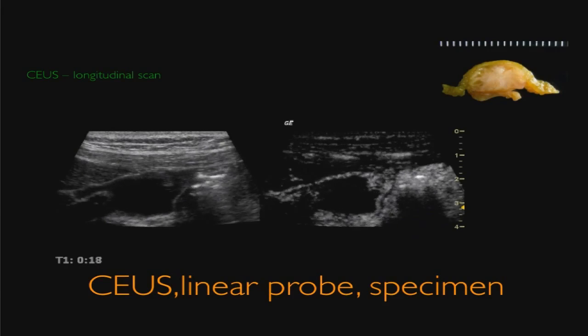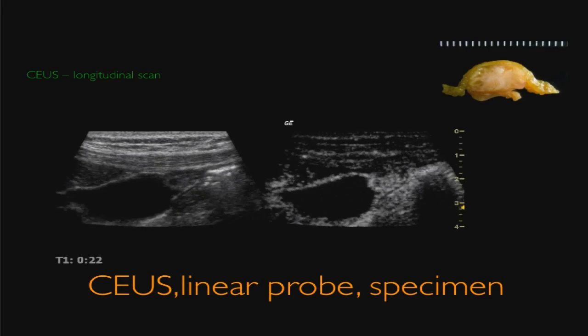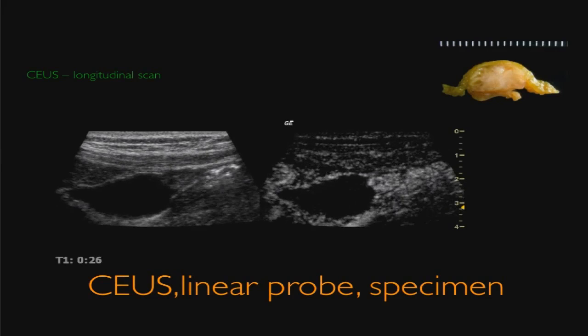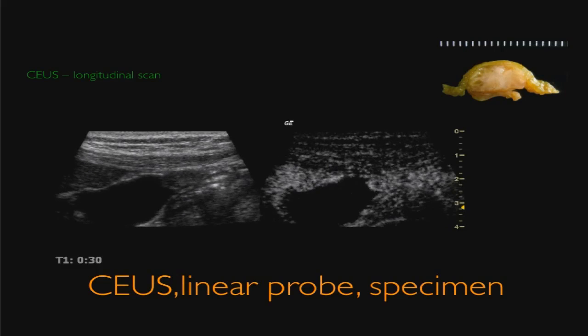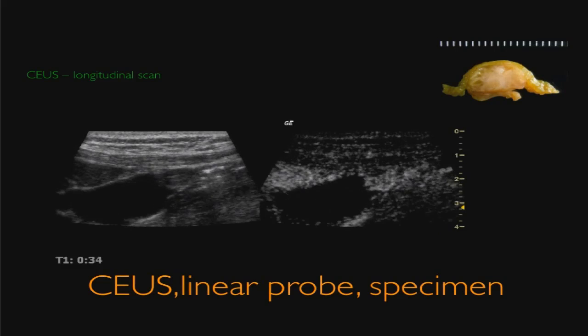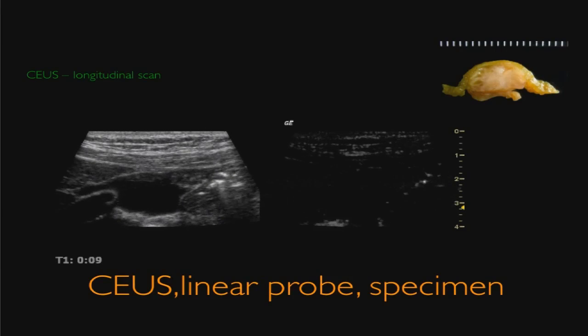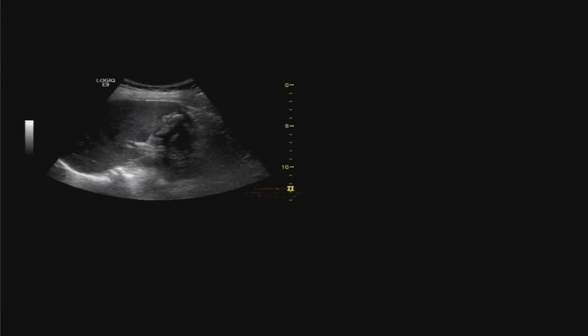These are the Rokitansky-Aschoff sinuses, and you can see there's a clear demarcation between the adenomyomatosis and the surrounding tissue. So it's a benign finding, but the patient, who had several cancers in the family, said, "I would like to have this gallbladder out," and that is how we found this tumor here. We could confirm the diagnosis by that.